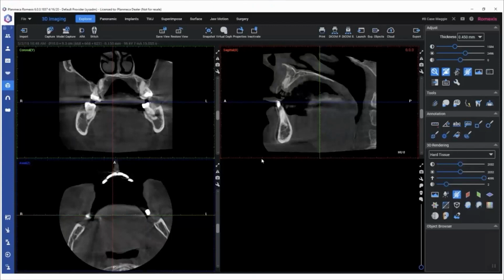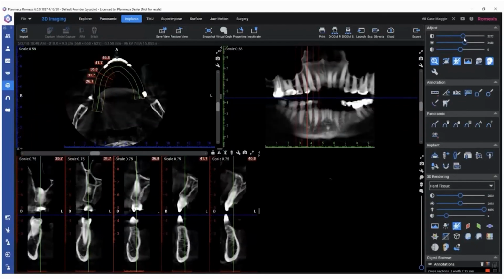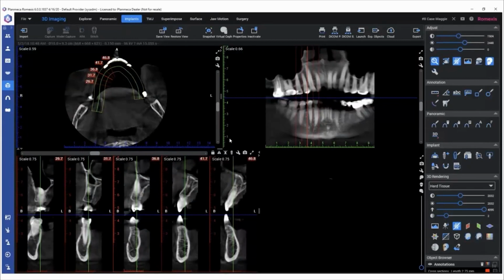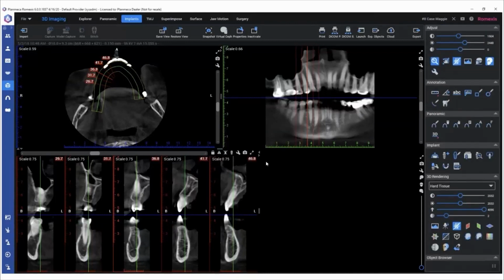First things first, we're going to capture our CBCT. And we've been using the Planmeca CT scanners for years. We have a Promax Mid now that we absolutely love. We're getting exceptional quality images, but it's really nice just to have technology all within one platform. I usually skip through what we would consider the traditional anatomical views when I'm looking at a CT scan for implant planning. I will usually jump right into the implant planning tab.